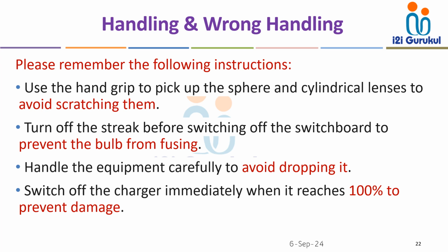The frame can go out of alignment if dropped. The trial lenses should be kept in a case to help keep them clean. These are the important points to be considered for your day-to-day practice.